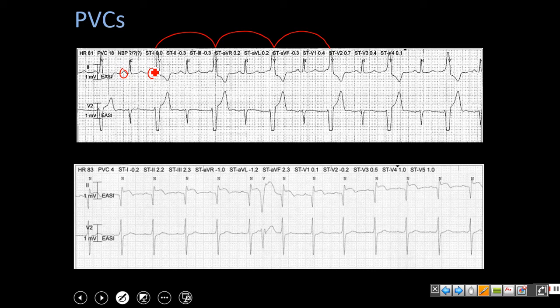And so before the ventricles had a chance to depolarize from that P wave, this ventricular depolarization occurred. And so it's basically just a fusion. As you can see here, it starts to slowly merge into that complex, and it disappears. And that tells me that it's not associated with that ventricular beat. So you see a P wave that's on time in front of that PVC, and it's not associated with it at all. Just wanted to point that out.